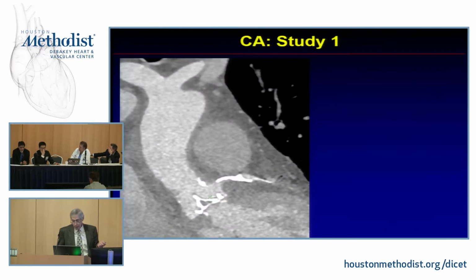And let's look at this. Again, what you see is that around the root is all of this darker area where it should really be minus 100 Hounsfield units. The Hounsfield units here are 23, and it's stuck right underneath this left main. That's the left main there.